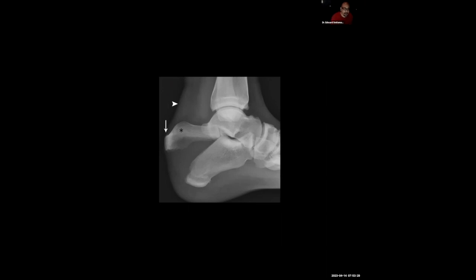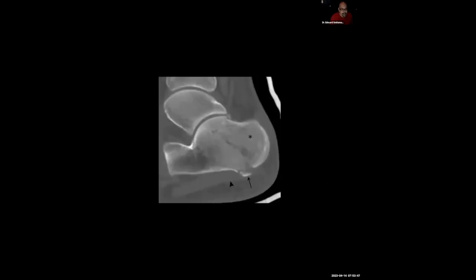And then typically our surgeon will take these patients about a week later for definitive osteosynthesis, as management of other injuries throughout the body is taken care of as well. Okay, so that's a nice tongue-type fracture.